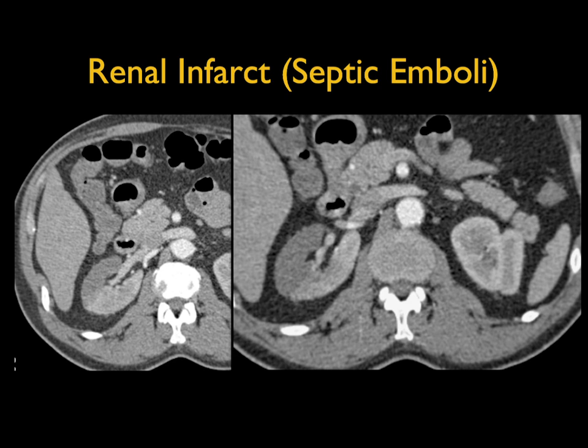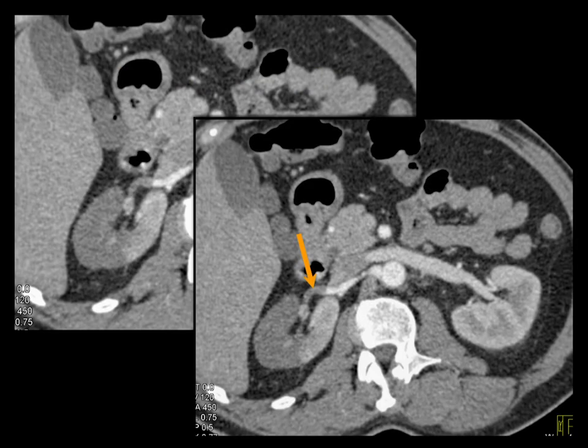You also look at the patient's right renal artery on these images, and you see a clot. And so there you see the clot again in the renal artery and the infarct of the kidney. Okay, left kidney looks normal. There it is again. So again, the importance of looking carefully at the vessels. The mighty arrow can help.